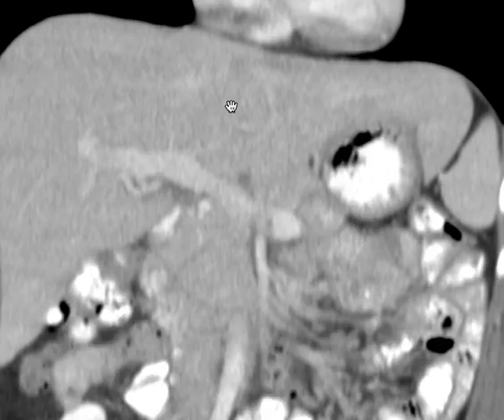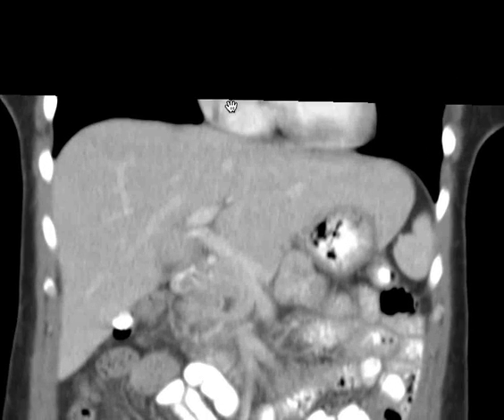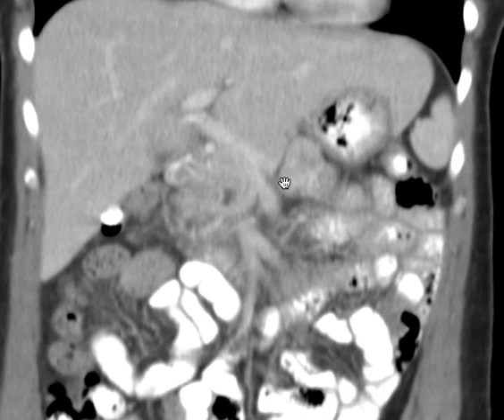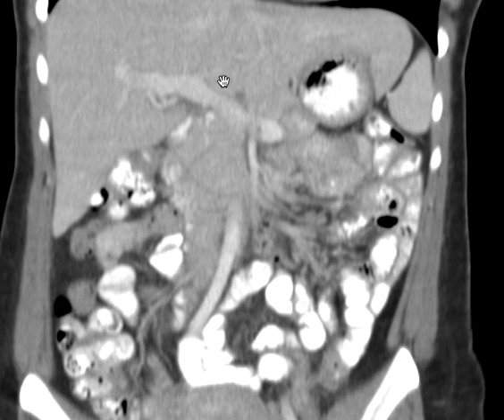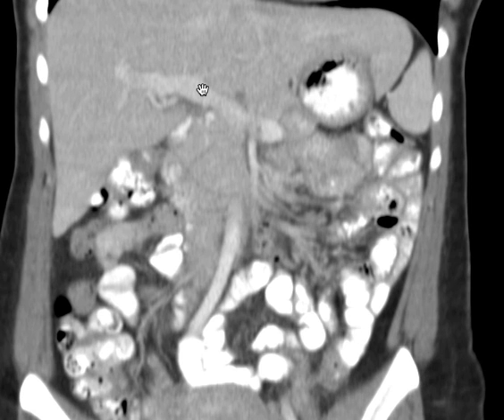Okay, and I'll go through a little bit of anatomy. Why? Because I love my anatomy, and this is some good anatomy. Cross-sectional anatomy, when you understand this, you really understand the anatomy as a whole. So, the stomach, as I pointed out, and what would be this venous structure coming into the liver a little bit obliquely, and once it gets into the liver, it branches.